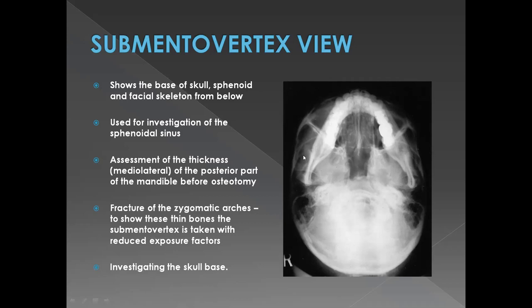So let me just show you an example of an underexposed X-ray. As you can see, these are very thin bones. When we have decreased the power of the X-ray, we can see these bones quite clearly. But since we haven't given the X-ray beam a lot of power, we can't visualize this dense area over here, and this is just appearing like a huge white blob.